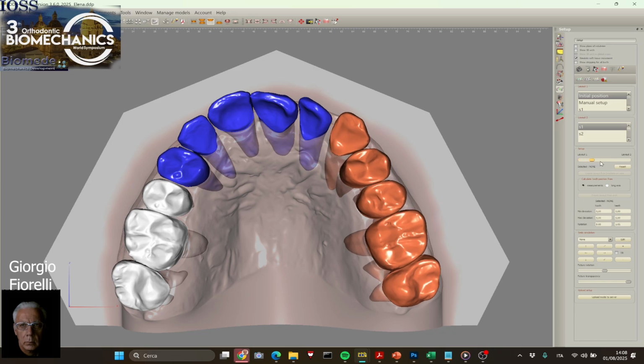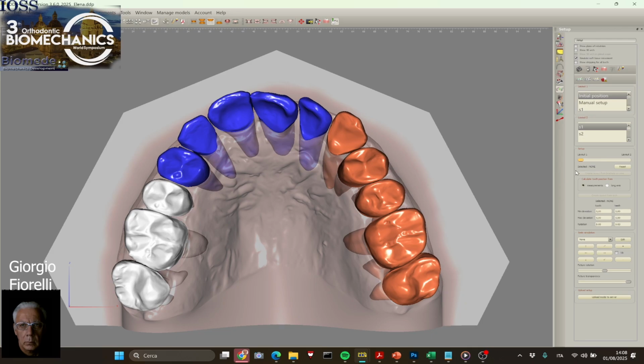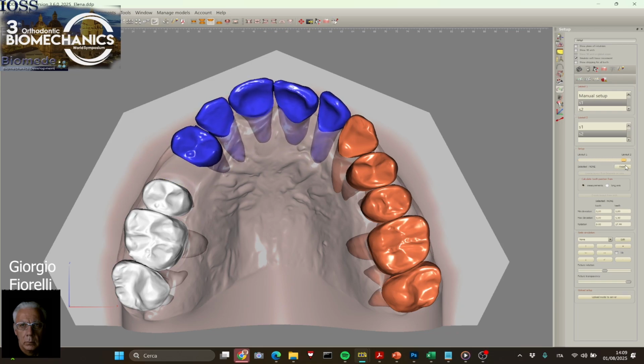And you can see the same movement in the occlusal view. This way we are creating some space to move the anterior teeth. At this point, when we have enough space, we can start moving the anterior teeth in this way. This will create space distal to the first premolar for an implant, and will create overjet and will roughly align the midlines.